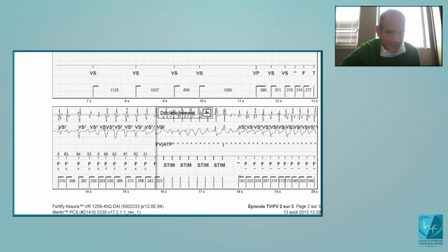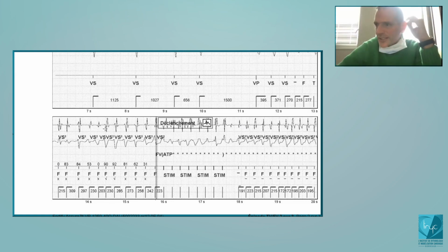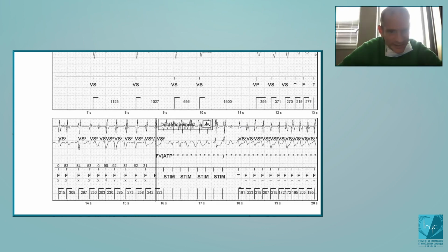Okay, that's clear. So the idea is to introduce what is called a noise counter. In a lead dysfunction, and I will show you a tracing just after, you may have some fast cycles in the bipolar channel but no fast cycles in the discrimination channel. Therefore there's going to be a discordance between these two channels.